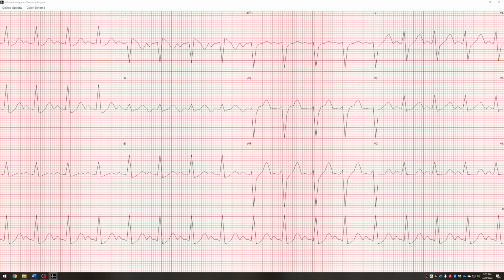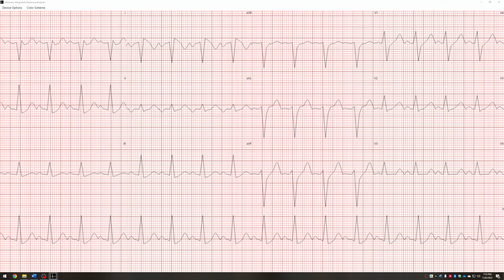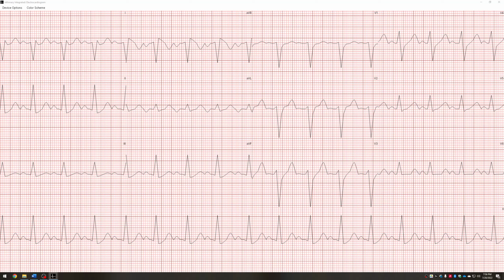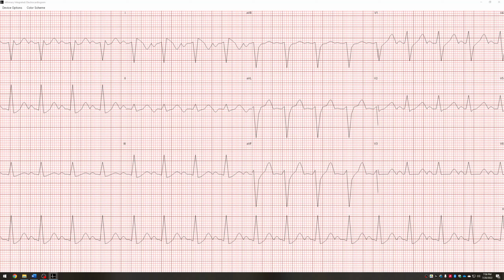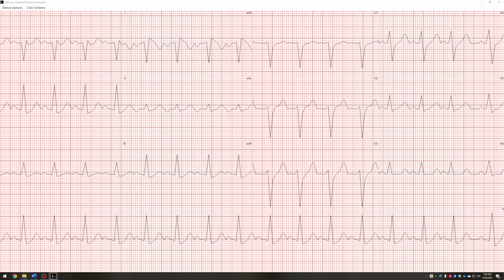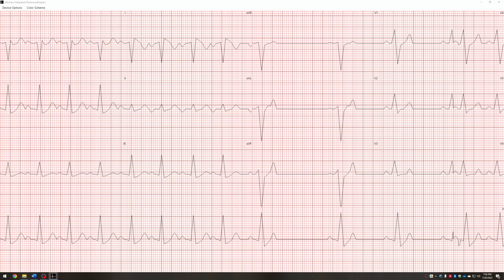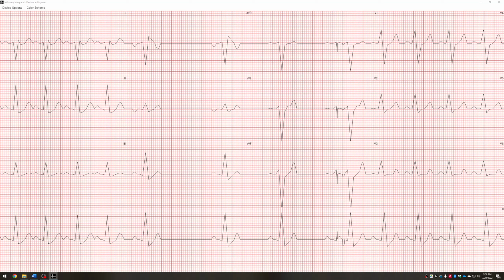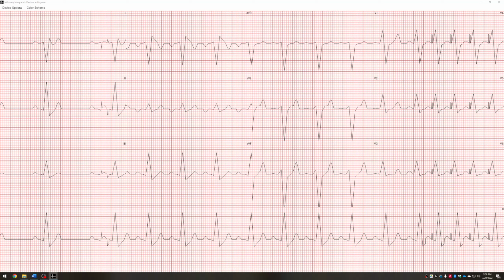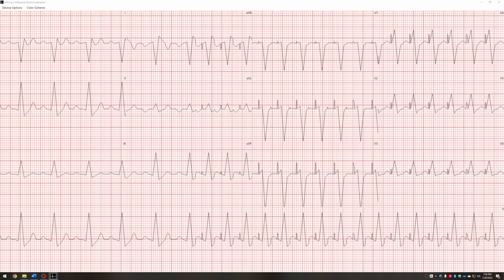We can change the cardiac rhythm in the middle of this. For example, I can switch it to a sick sinus syndrome while retaining, actually it did reset some of the wide QRS complexes and the QTC intervals, but we can mix all of that, see how Infirmary draws it, and then you can set up a scenario or do a screenshot of a tracing and print it out, however the morphology you'd like to set up.